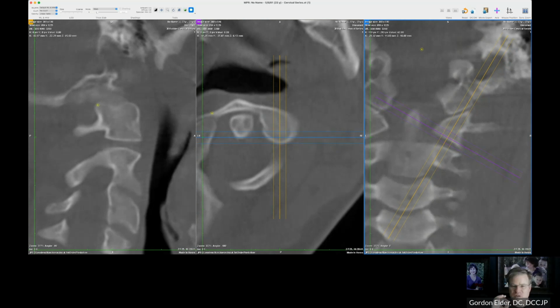Dr. Blair was so focused on the joints because if a bone misaligns, that must be where it misaligns, so when he's talking about C1, we're only talking about C1 in relationship to the skull. We're not talking about C1 being misaligned from C2 and the skull, which I think would be kind of hard to do if it was just one simple misalignment. It's like taking a cue stick and just hitting the atlas and it moves forward in relationship to the axis and the skull.